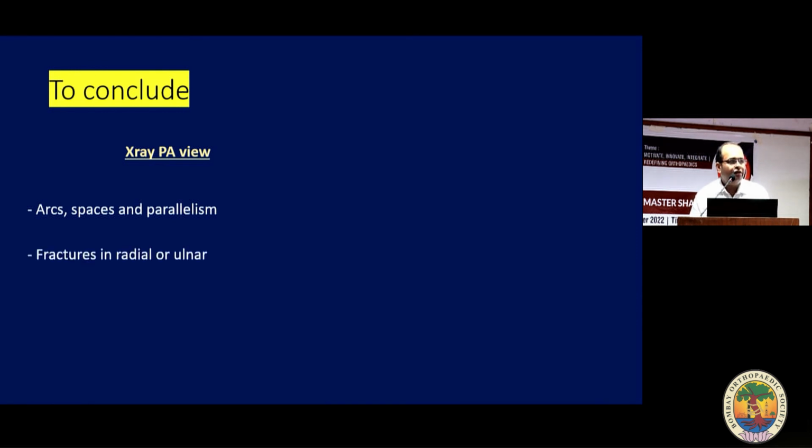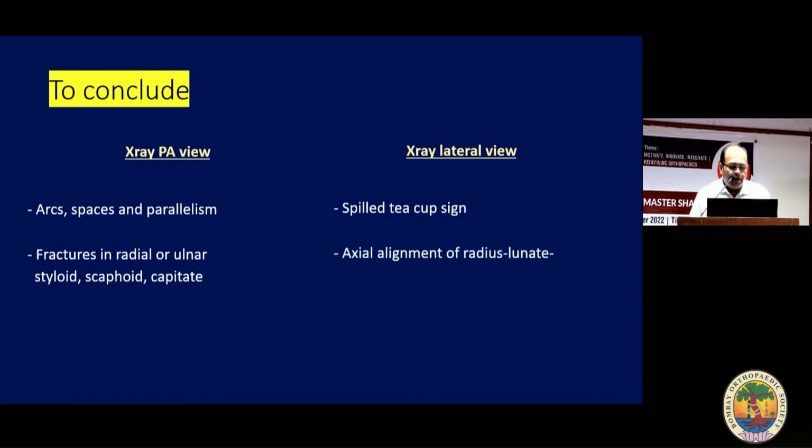To conclude, on the PA view of the wrist, we have to watch arcs, spaces, and parallelism, and look for fractures of the radial or ulnar styloid, scaphoid, and capitate. On the lateral view, the spilled teacup sign and the axial alignment of the radius, lunate, and capitate, as well as the third metacarpal, have to be seen. And take a full-length forearm X-ray to rule out proximal fractures or dislodgement of the carpus.